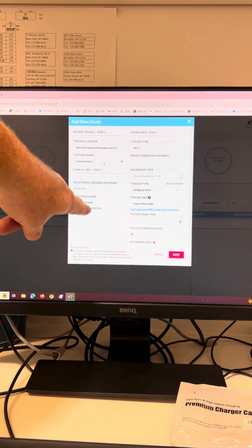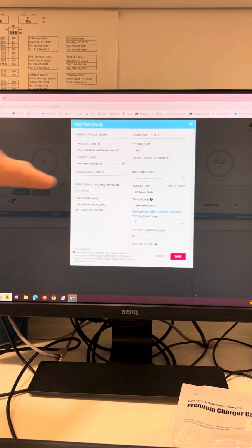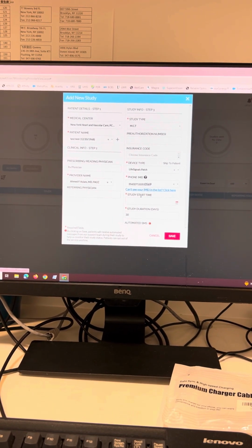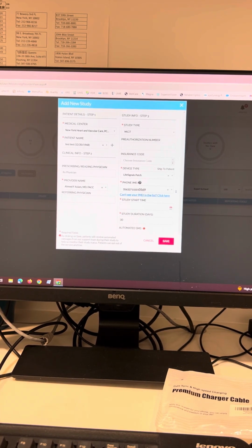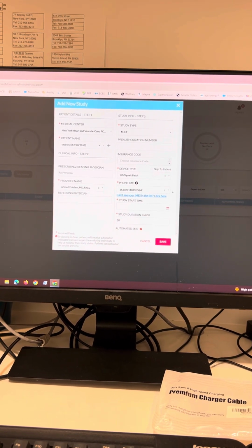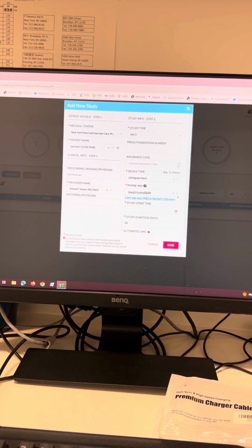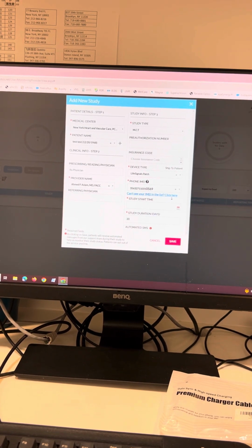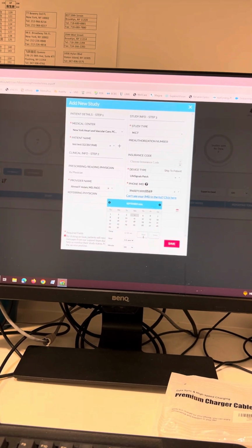Once you choose the patient's name, the provider will automatically come up. Perfect. Okay, so now choose phone IMEI. This is like your serial number. So you have 2 phones, but you can only have 1 test going on at a time. Only 1 at a time. If you need to do more than 1, then we'll talk to Dr. Aslam and he can let us know. But really you're doing this test for Fidelis patients because they don't pay for the Holter. And you're also doing it for Medicare patients because with Medicare it pays more than the Holter. But let Dr. Aslam, or his assistant or his fellow doctor, tell you which test they want you to do. But really, we're still diagnosing arrhythmias. It's pretty much the same indications.